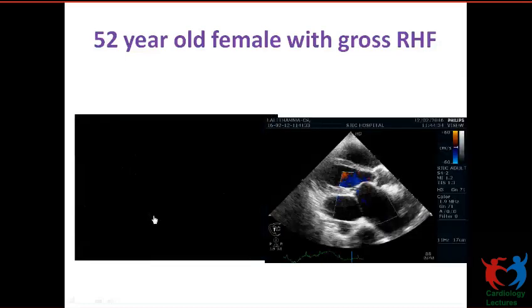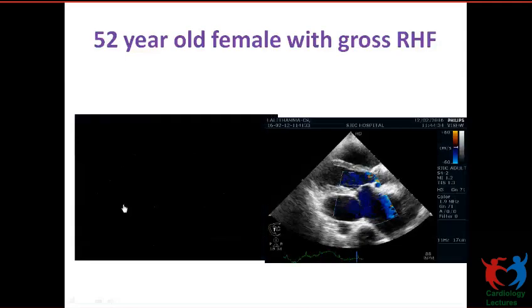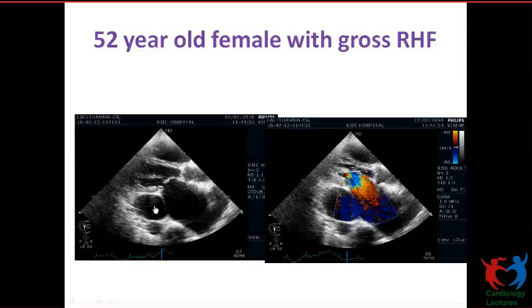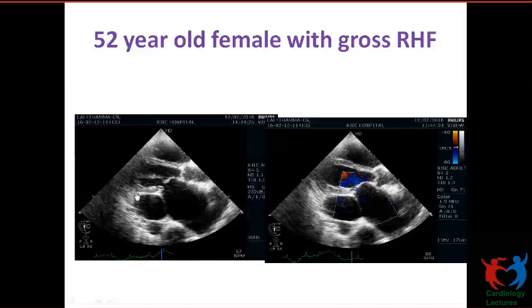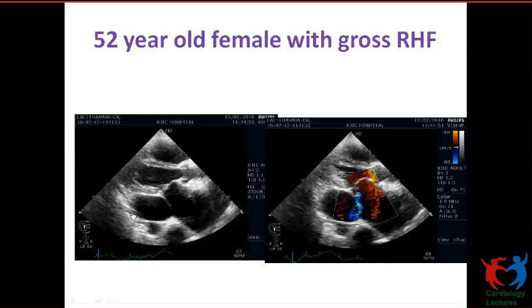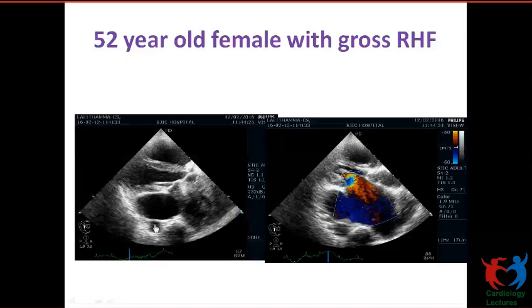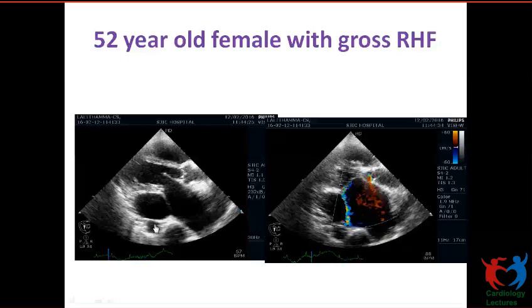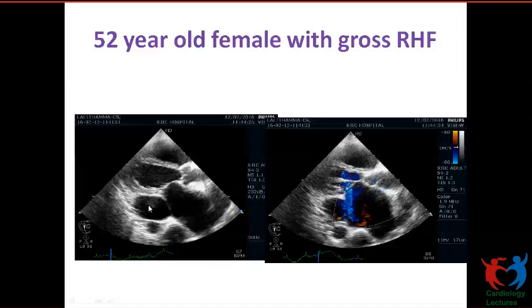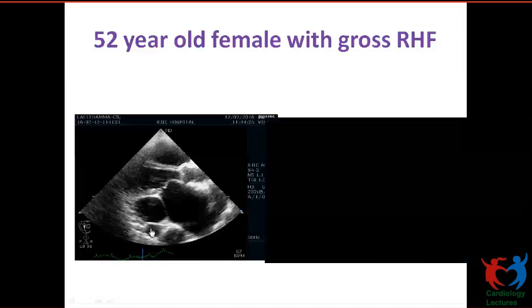It can be a posterobasal aneurysm. Yeah, can be there in that location. Submitral aneurysm. And it could be loculated pericardial effusion also, because we're not seeing any flow into it. Is it LA appendage diverticulum? So how do you differentiate the usual question? How do you differentiate whether it's aorta or inside the pericardium?